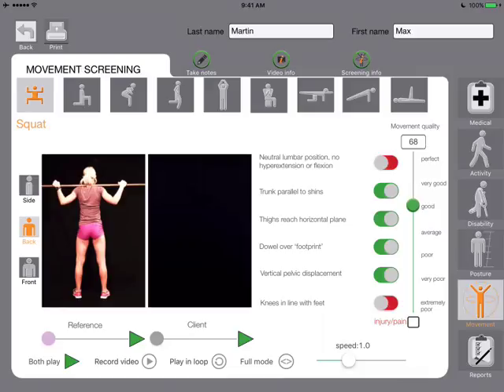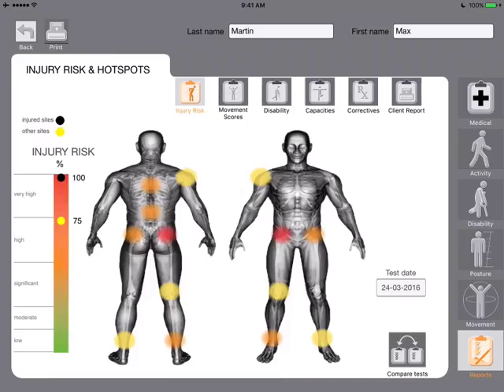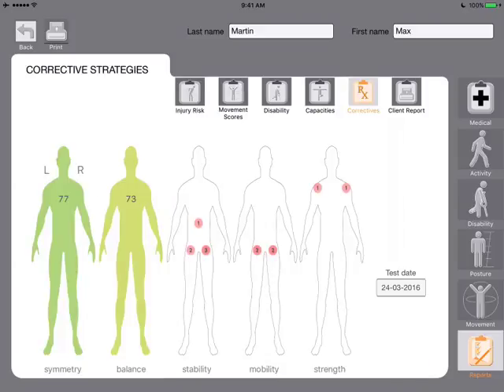So someone that continuously has knee alignment issues during their assessments is likely to score mobility issues in the ankles here, which obviously this client doesn't, so that wasn't the case for the data that we put in, and stability issues in the hips, which in this case, for example, this client does.